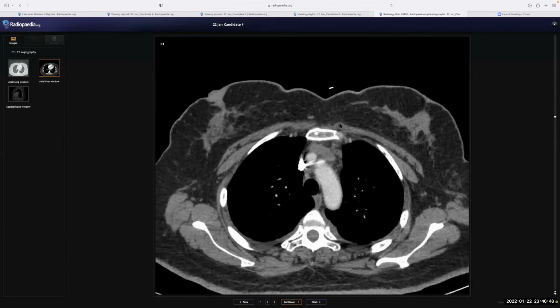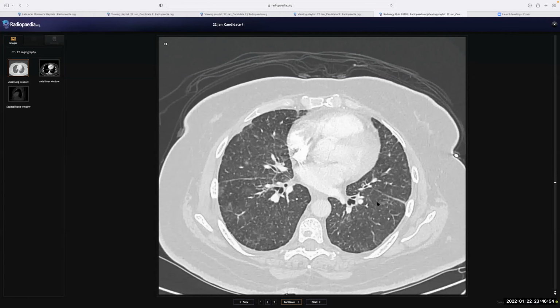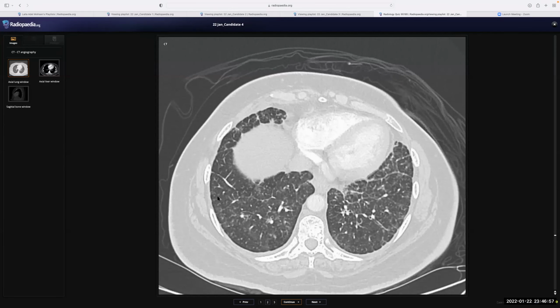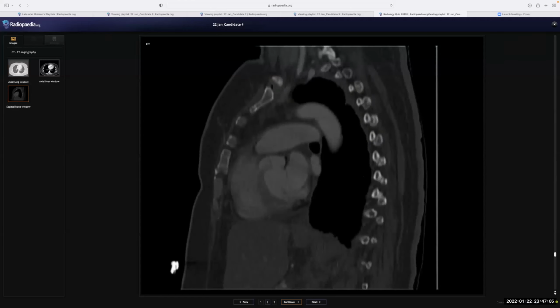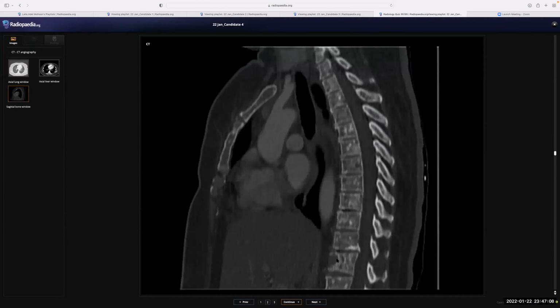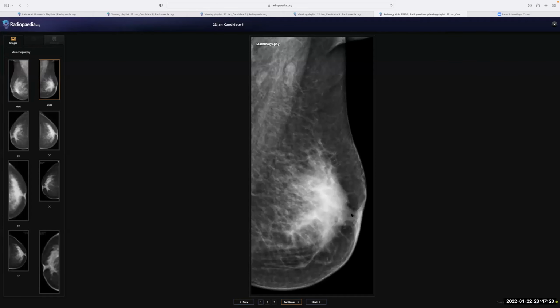I think that abnormality also, she had lymph nodes and lymphangitis carcinomatosis, I think. Yeah. So again, there is interstitial thickening and multiple nodules in both lungs. Lymphangitis. Yeah, so she did have lymphangitis carcinomatosa and bone metastasis as well. Lytic and sclerotic. Yes. Okay. But the most important thing is the history and the parenchymal asymmetry. So even if we don't know if it could be bilateral, at least mention that there is some abnormality in the mammogram and this patient needs to go for ultrasound.